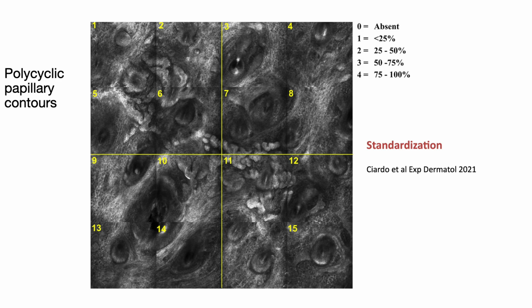So with confocal microscopy, we are able to quantify the amount of a certain feature in a certain part of the skin.